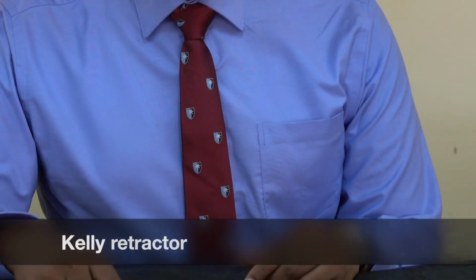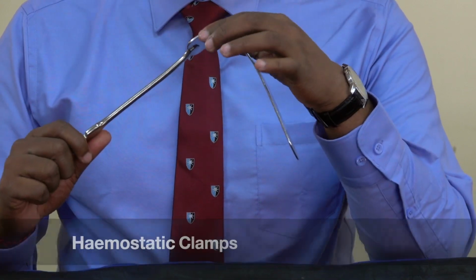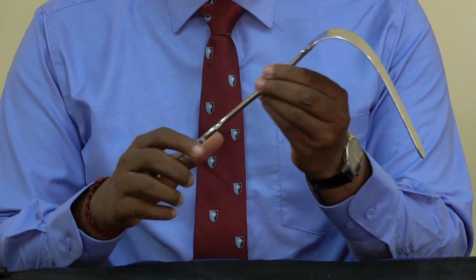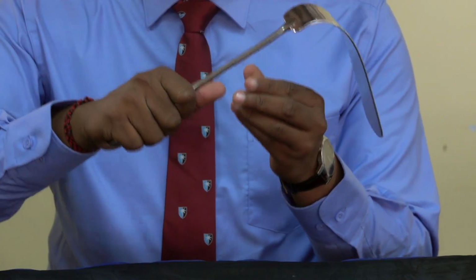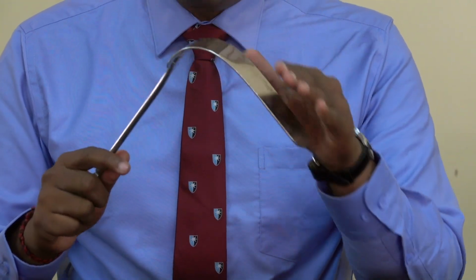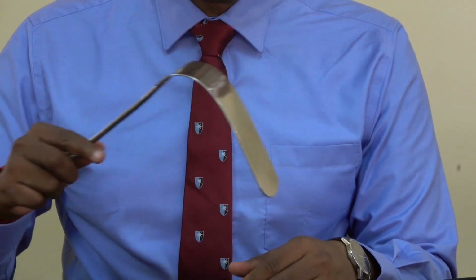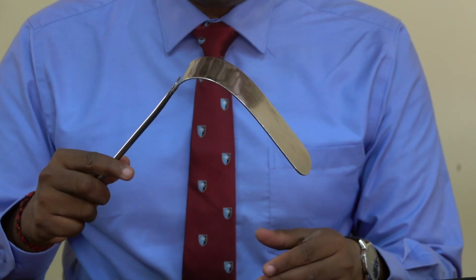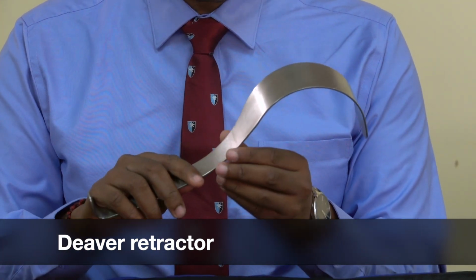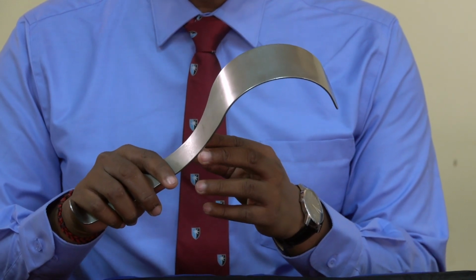The second commonly used retractor in gynecological surgery is called Kelly retractor, which has long and broad blades. It has different shapes and sizes also. It also has a handle with a grip, and the blade is acutely bent, and it has a broad and long handle, which helps to retract the tissues in the deep pelvic cavity. And another one is a Deaver retractor, which also helps in gynecological surgeries to visualize the tissues in the deep pelvis.